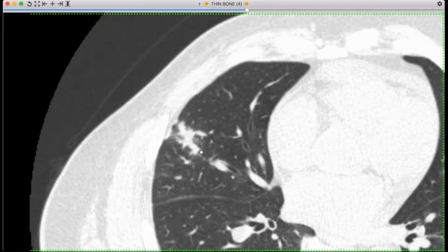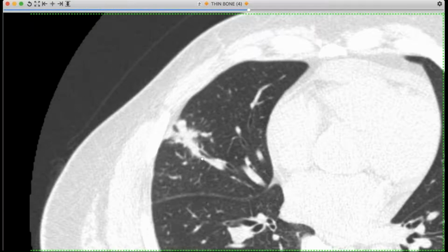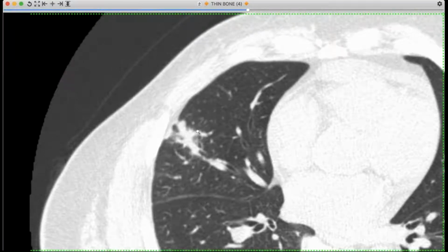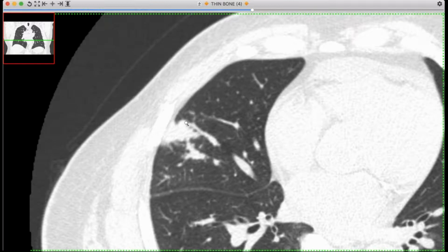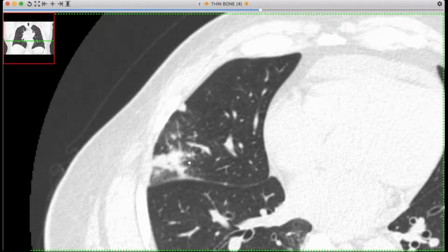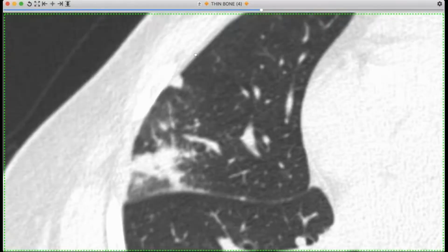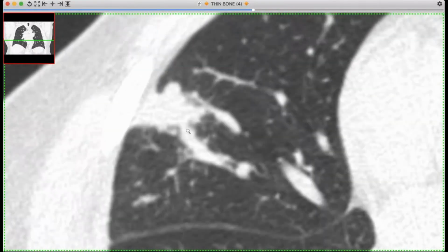I can't tell if it's abruptly cut off or if it is just disappearing, but the shagginess of the vessels around it bothers me, and it was reminiscent of cases of endovascular metastases I've seen in renal cell. You see a fair amount of renal cell and a fair amount of these types of metastases. So I start seeing dilation of the veins, with little side branches that normally aren't even visible, suggesting there's an obstructive process there.